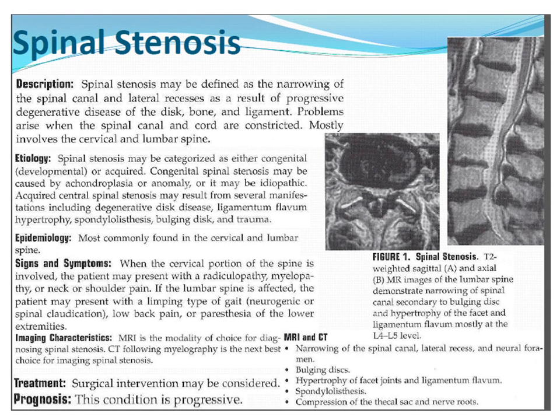This one's a really severe one. It can be contributed by several things. So one thing is overall, you can see that this disc, especially if you compared it to the vertebral body above, is diffusely bulging. So it just has kind of gone from this to that. And whenever you see that it has this flattened and slightly bulging posterior contour like that, you know that that's a diffuse disc bulge.